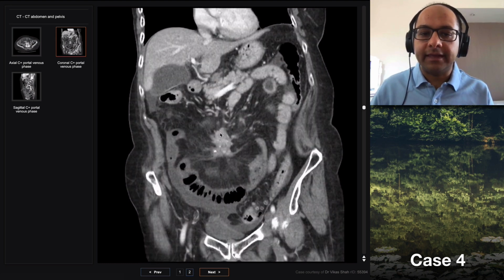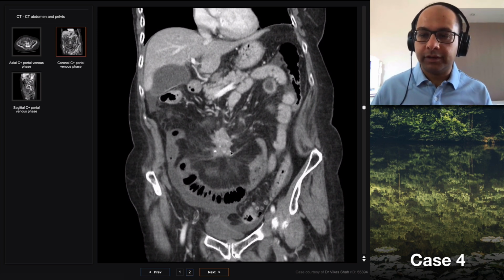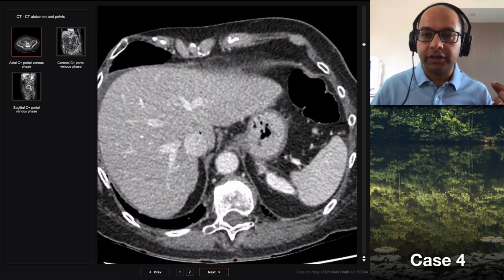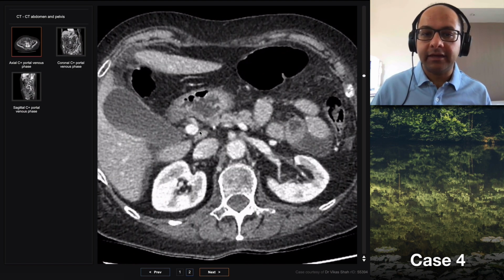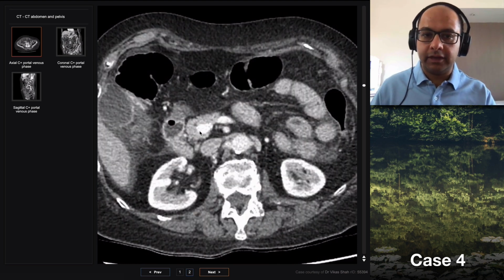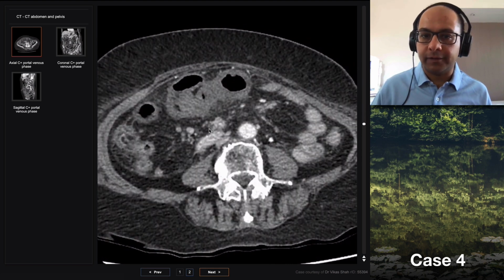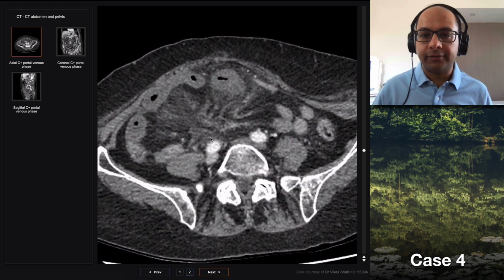And then don't forget that this is a very vascular lesion, and the metastases from this lesion to the liver will also be hypervascular, and they may well be obscured on a portal venous phase study of the liver. So you really need an arterial phase study of the liver to clearly see metastases from neuroendocrine tumors. So when you're doing the chest CT, you should do that in the arterial phase and extend to involve the liver as well. And then, of course, in due course, you'll be doing all the neuroendocrine studies to work up this tumor in greater detail. Okay?